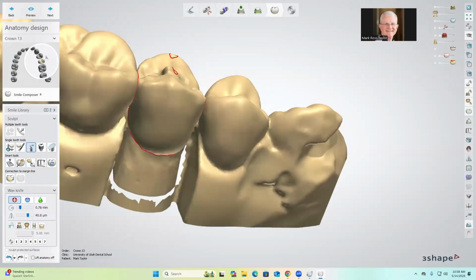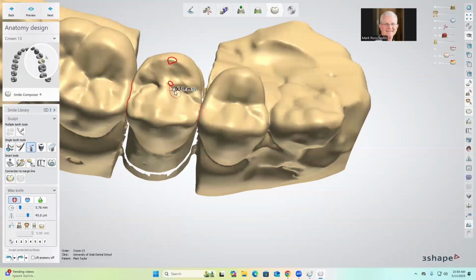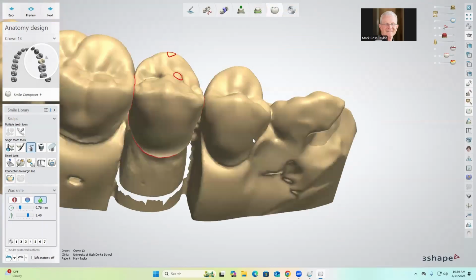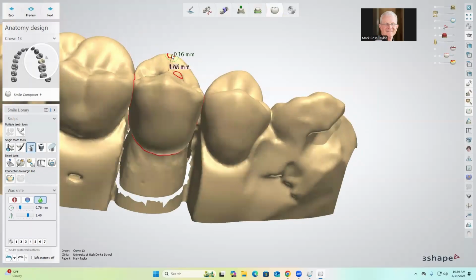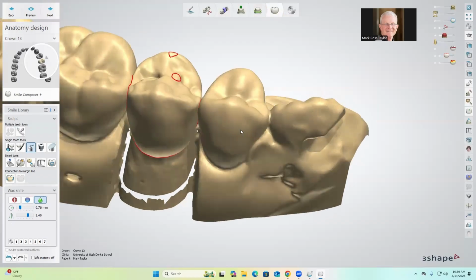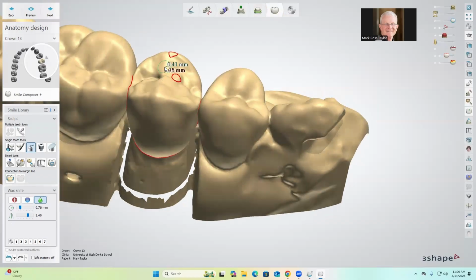But if I don't like it, undo it. It's right now having to reach for that contact. So right in here, I'm going to create something more over here so it's not on the slope. Now I've gotten two positions right in here. Nice pattern here and a nice pattern here that's creating a nice flat slope. If you create two positions of flat contacts and you accidentally finish one out, you're good to go. You at least have the one.